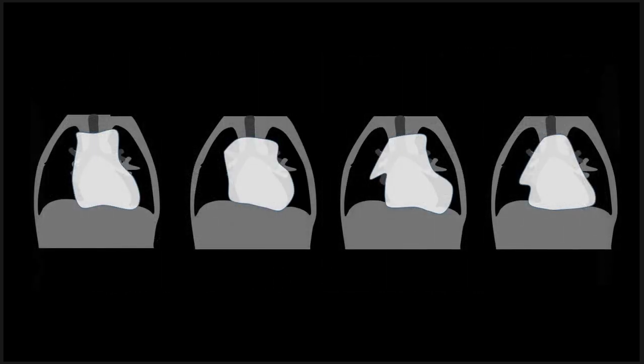We discussed in the prior talk that in children less than 5 years old, particularly in infants, the thymus can have a wide variety of different configurations. It can be wide, rounded, you can have a triangular opacity like we have in this case, or sometimes it's just a bulging that blends in with the right heart border. It can be variable and different, but not look like this case that we have today.